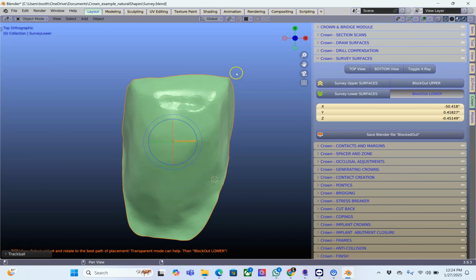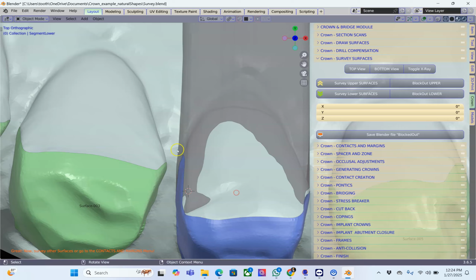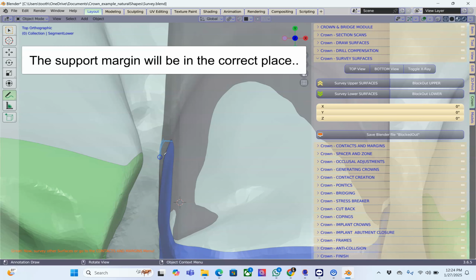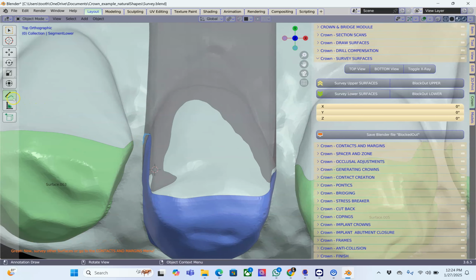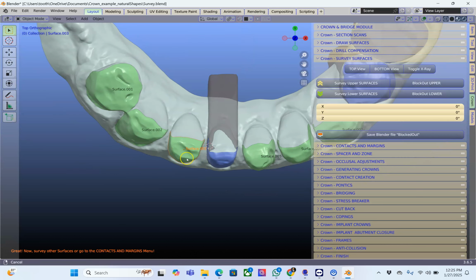And even though the extruded model looks like it goes away from the model, this is the correct way, because when we create a margin, the edge will then extrude out here so that it becomes a proper veneer. If you don't do that, then this extrusion will not happen, and you may end up with a very different result, which is not favorable to making these veneers. Okay, I'm going to hit the fast forward button and then continue.